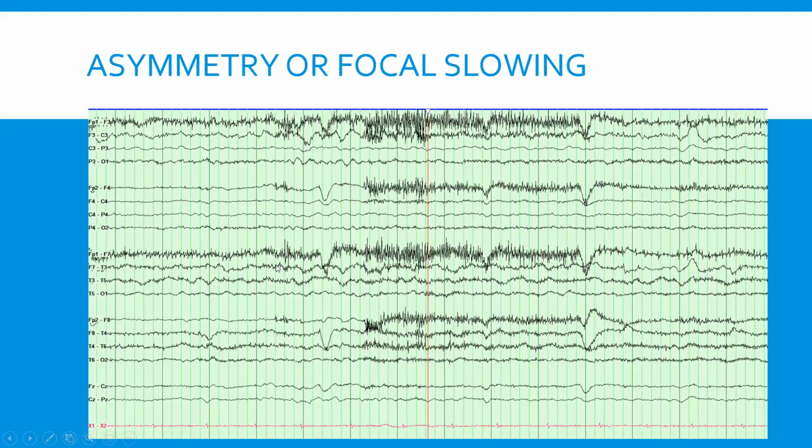So this is an EEG that I had, and I do apologize, it's a little bit subtle, but I think we can see it, right? Just to orient you, this is odd, so that's on the left side, and this is on the right side. So left and right, and this is also left, and this is right. If you compare the left to right, you can see that there's some slow activity. This is what we call 3 Hertz activity that we don't really see here. And comparing the left temporal to the right temporal, it's more obvious. You see these big slow waves.